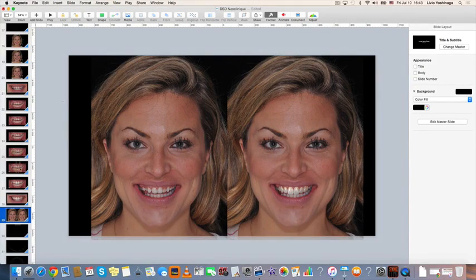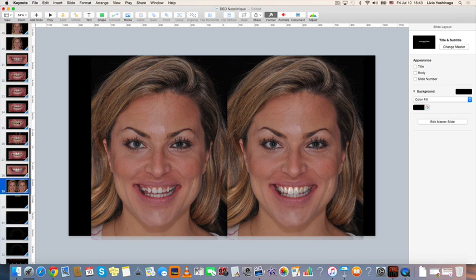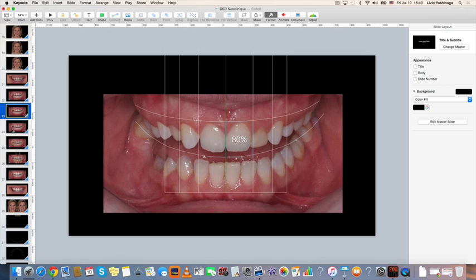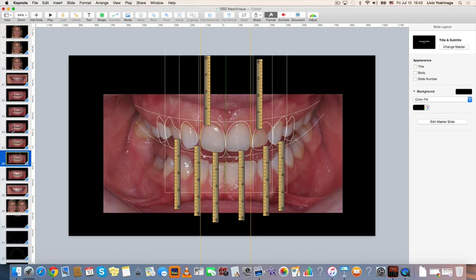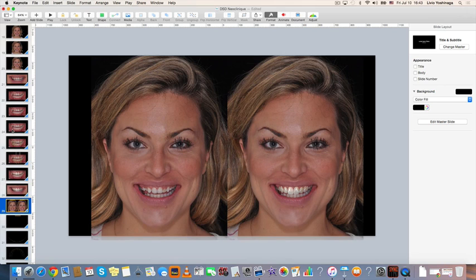And with this, you have a full tutorial video very quickly of Raquel's smile design. Most important is the 8 steps: horizontal, vertical, smile curve, interdental ruler, transferring to the other line, transferring this to the model, then making your project the size, the dimensions, so the technician can do the wax up, and then painting the teeth, putting in the image with the lip, and then expanding, unmasking her, creating a before and after simulation. So this will help you to revise.